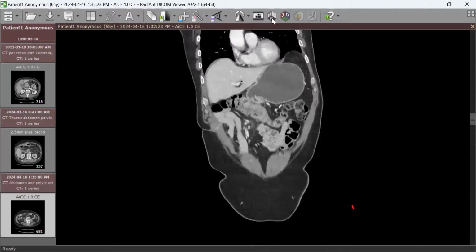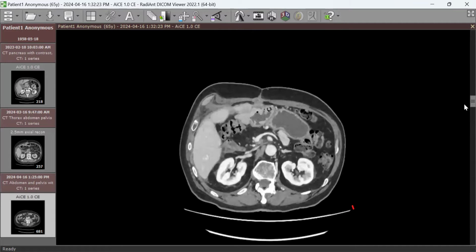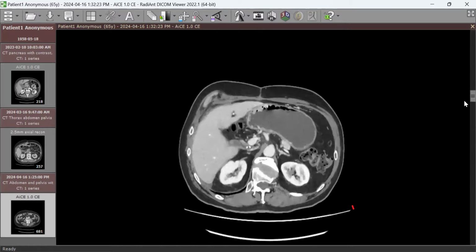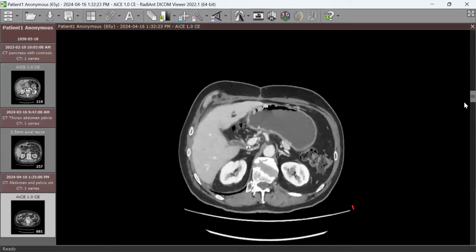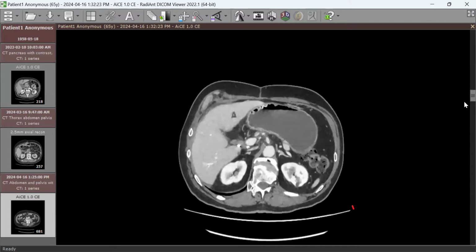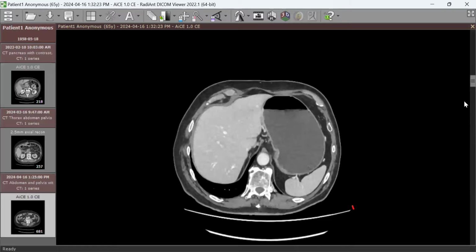And if we go back to the axial, so they either do pancreaticojejunostomy or pancreaticogastrostomy, so that they link the remaining pancreas with the bowel. So we have 4 components now: gastrojejunostomy, hepaticojejunostomy, pancreaticogastrostomy, and cholecystectomy. Whipple's procedure.